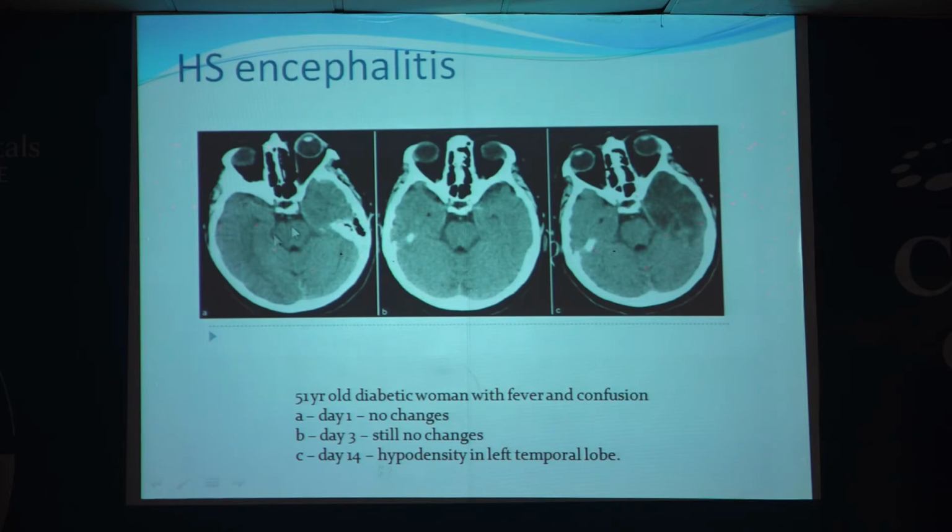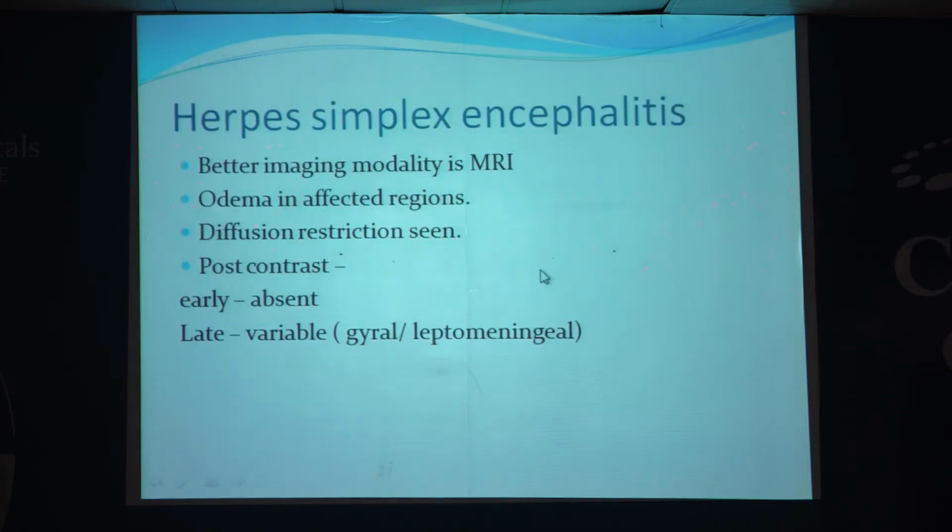But day 1 CT was normal. Even on day 3 CT was normal. Only on day 14 did the hypodensity in the temporal lobe develop. So that is why MR is a better modality, where we can see affected regions will show edema and diffusion restriction.